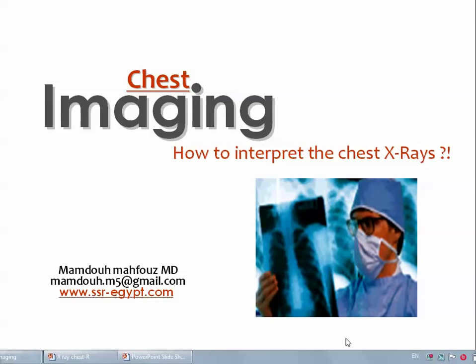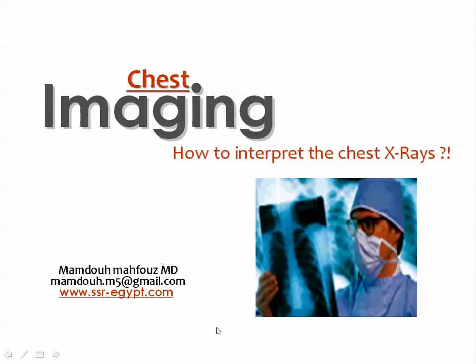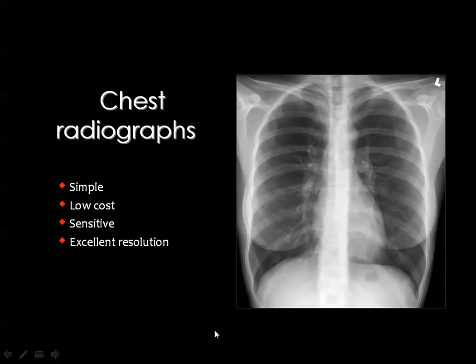The interpretation of a chest x-ray is, let us say, not that difficult, but it needs some special protocol or a simplified way in order to reach most of the values of this very simple radiographic technique.